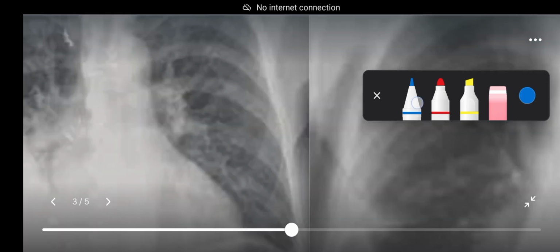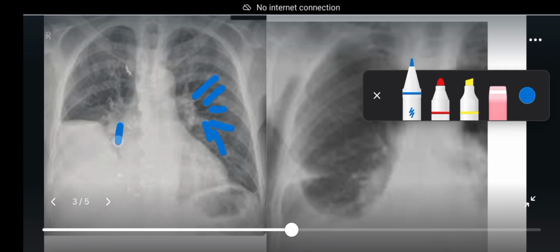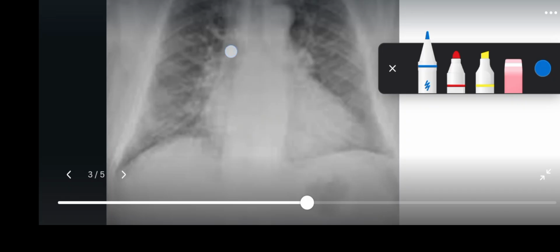The vessels will appear as if they have hair around them. It will become indistinct. You see some appear blurred. Then look at the other side. Look at the blurring of the cardiac and pulmonary vessels. Of course, you see the cardiac borders will be blurred. You see it will not be distinct. The borders here are blurred. It's not that clear. So you see these opacities everywhere.